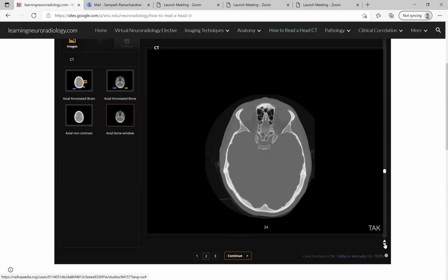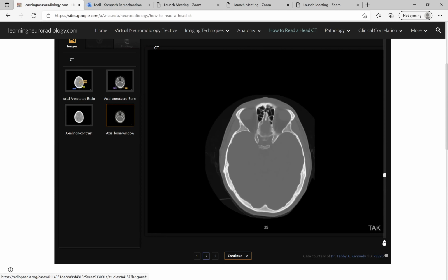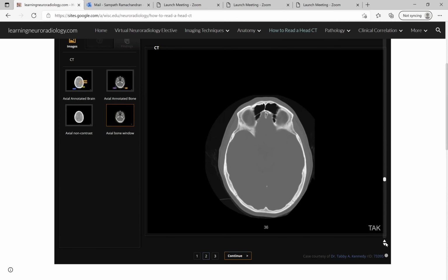And these are also important here. These are the frontal sinuses you can see. And sometimes we can see pathology there, which is more basically benign things like sinusitis, because you can see fluid within the sinuses, which can sometimes indicate an acute inflammation there. But we can get quite a bit of information from just looking at the bone windows.